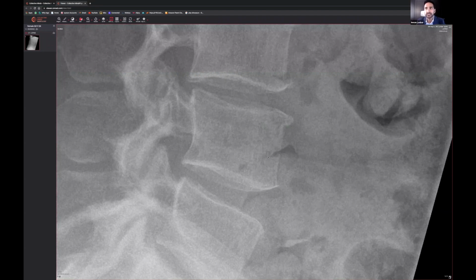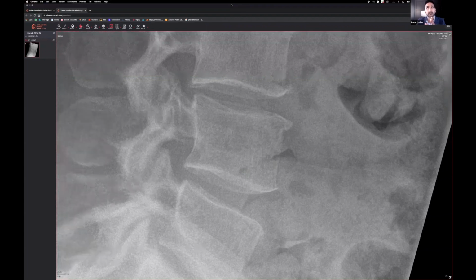Some of you may have spotted that there's radiolucency over here. You think, okay, we've been talking about fractures all this time. Could this be a fracture? It may be a fracture, may not be, but hang on, hold your horses. Yeah, okay, fine, there's no sclerosis as you come to the edge of this radiolucency, but have you noticed how the radiolucency goes beyond the cortex?